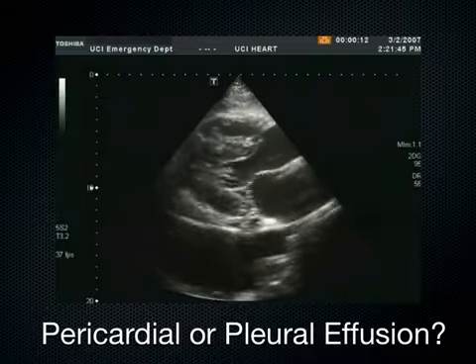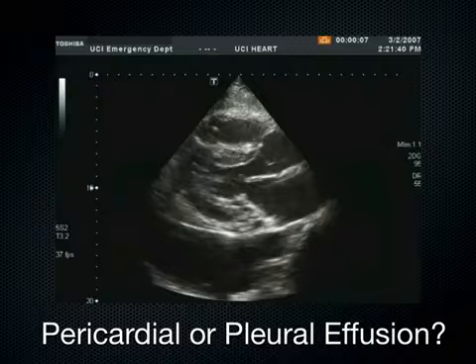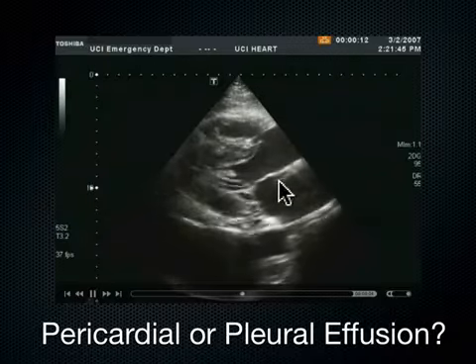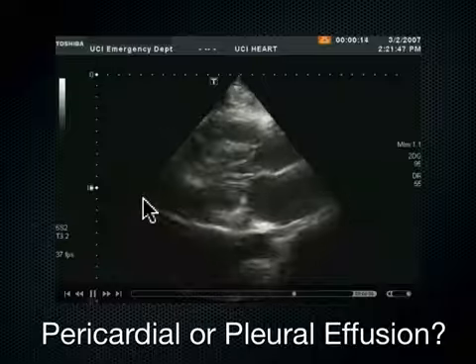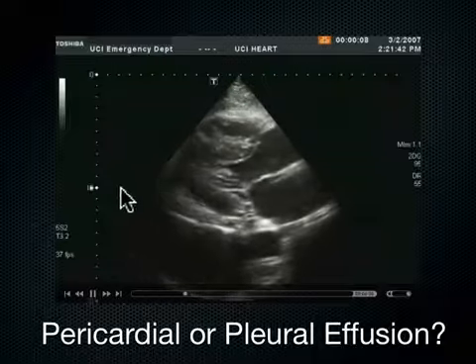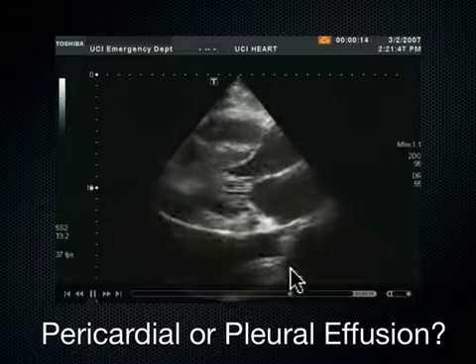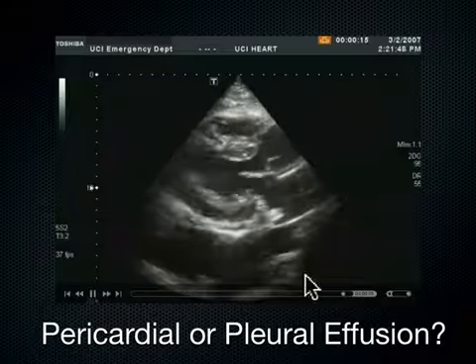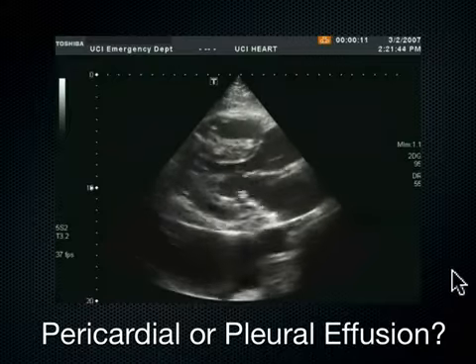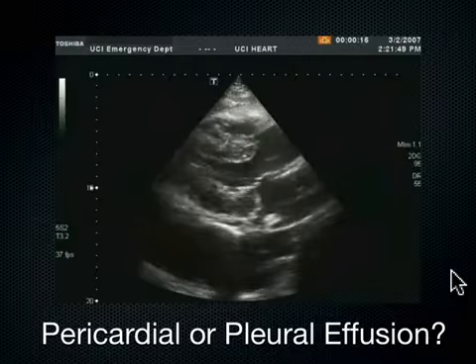Okay, last slide. Is this second to last slide? Is this pericardial or pleural effusion? This is the parasternal long axis of the heart, RV, LV, LA. Okay, the myocardium is back here. Is that also the pericardium? Is that white line the pericardium or not? The answer is yes. This is posterior to the descending aorta. This fluid comes along, as Dr. Landorf is saying here, posterior to the descending aorta, and therefore, this is a pleural effusion. Confusing. I agree. It looks just like a pericardial effusion.